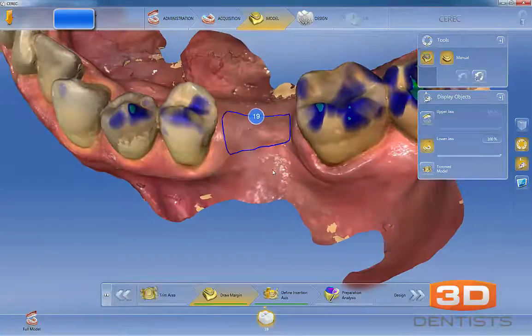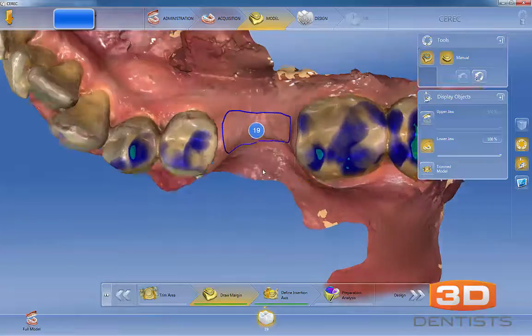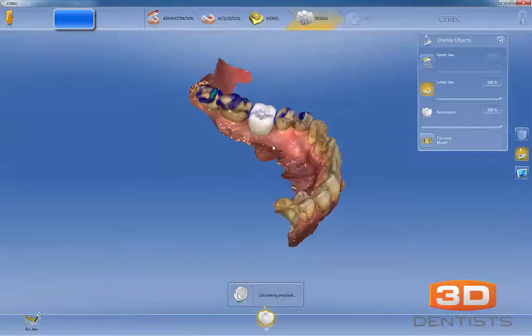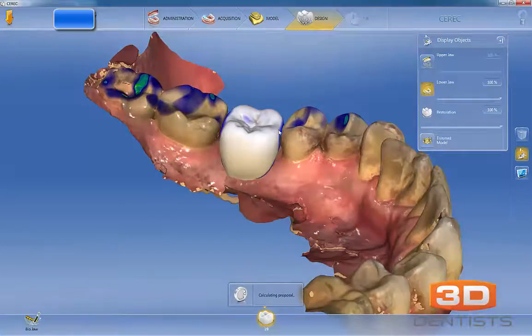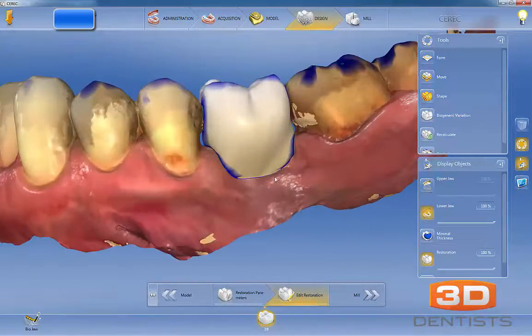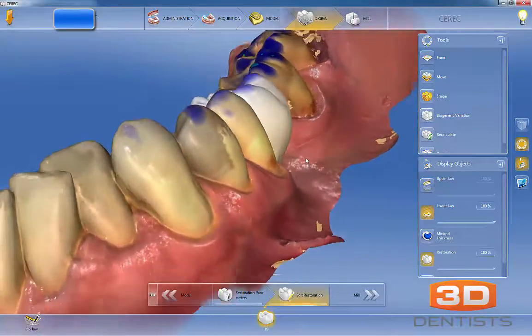so like so. And I know that doesn't look exactly correct from the occlusal, but that's going to be our emergence profile. Then when you go back to the design, you'll see that the occlusal and the overall design won't change, just the gingival area should be the part that changes there, just like so, okay? And now what we have is something that better represents an ideal restoratively driven implant placement.